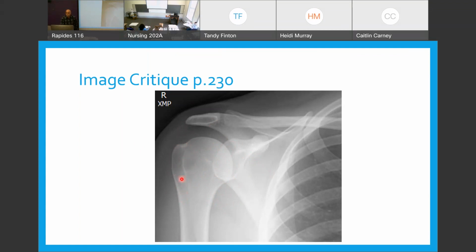This is your what? Greater. How do you see the greater? External. All right. Position of the hand. External, thumb pushing out. Relationship of the humeral epicondyles to the plane of the IR. They're parallel. How many questions we had off of that? About 5. Are you okay with this? You just trying to find it on that little chart. I was trying to compare it. We'll find it. You good?